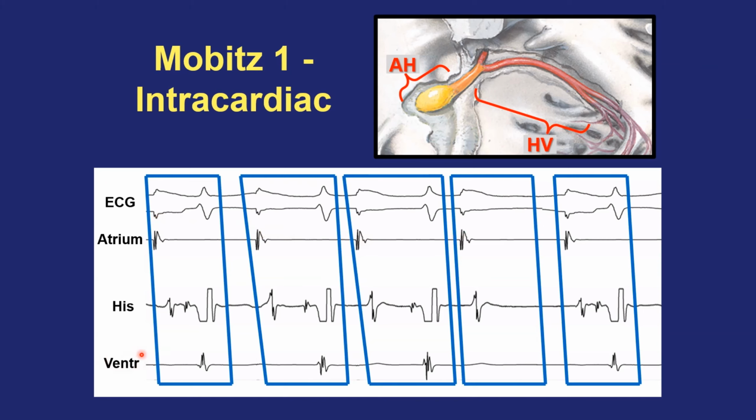And then the right ventricular electrogram times with the surface QRS, and there are 4 of those, with the 4th beat being absent. And then, as we reviewed before, the His bundle electrogram, which records signals from the atrium, the ventricle, and the bundle of His itself, because all of those are within the field of view of this particular bipole. And I'm going to label those for you right here.